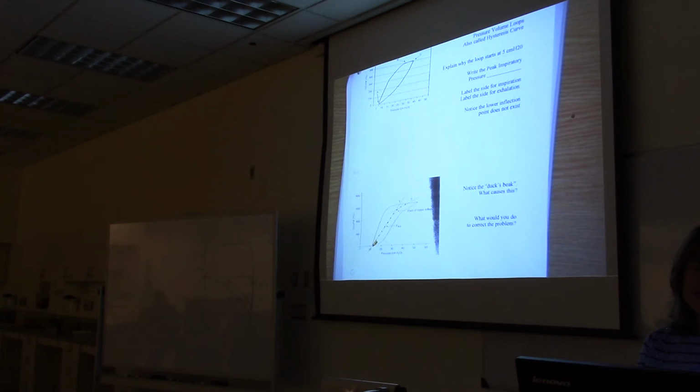All right, so what you see is during inspiration, the alveoli pop open, now the volume is going into the lungs, and after maybe around 500 mLs of volume are in the lungs, to get the last 100 mLs in, it takes a lot of pressure to force that extra 100 mLs in there.